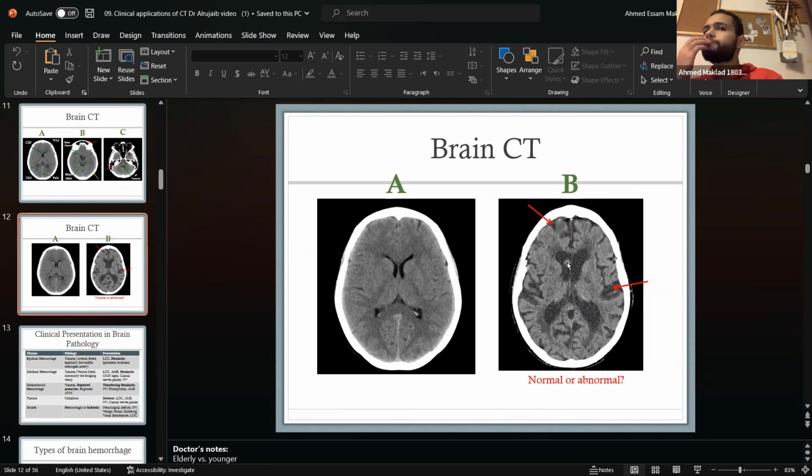What is happening here, guys? Yeah, perfect. So you can see here that there's no edema and there's no hemorrhage. There's shrinking. So see, that's the thing. If it's hemorrhage, it's going to be bright. Keep that in mind. If there's hemorrhage, it's going to be whitish in color, not dark. What's happening here is that there's atrophy of the brain tissue.